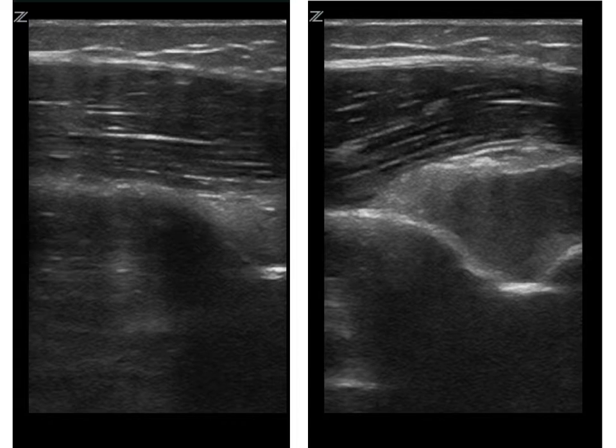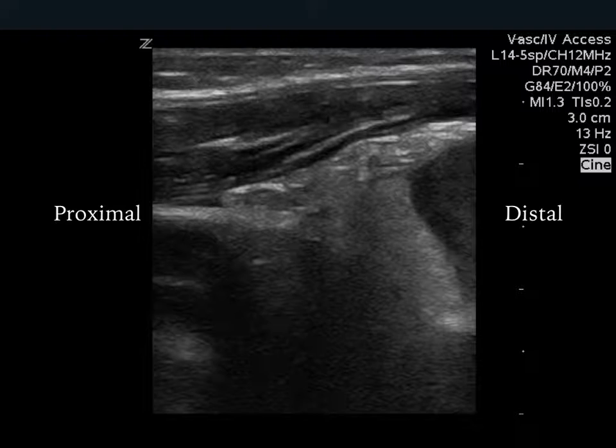Now I know we are moving quickly, but which elbow has the effusion and is therefore more likely to have a fracture associated with it? We start by drawing a line that continues along the posterior cortex as it dives into the olecranon fossa. Does the posterior fat pad stay tightly adherent to the olecranon fossa? Well, it does in the image on the left, but not in the image on the right. The image on the right has the elbow effusion. Can you outline the posterior fat pad here?